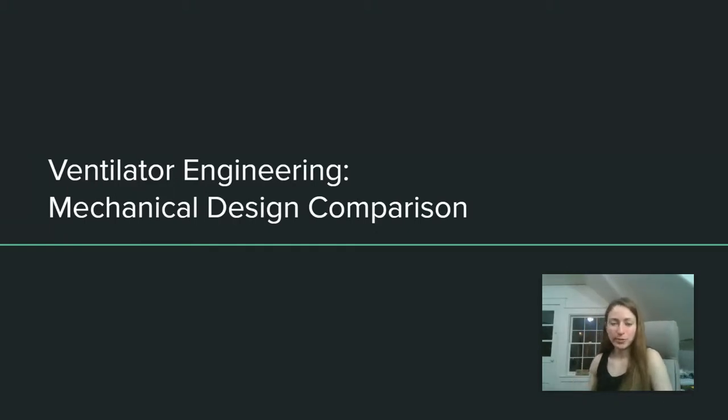So for today, we're going to be looking at three projects in particular. And these are the Mechanical Ventilator Milano project, or MVM, the Operation Air project run by TU Delft, and the Vent for Us project, which is run through a Stanford, Utah collaboration. So I hope you can capitalize on all of the awesome open source materials that are out there for your own work and improve upon all of our stuff too.